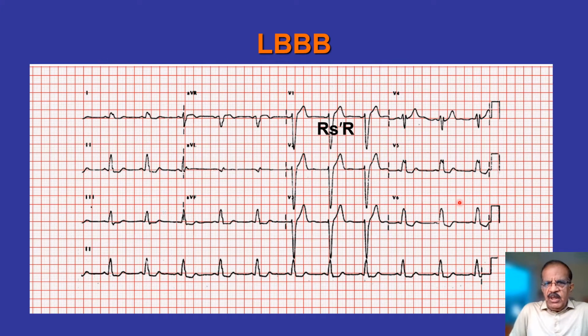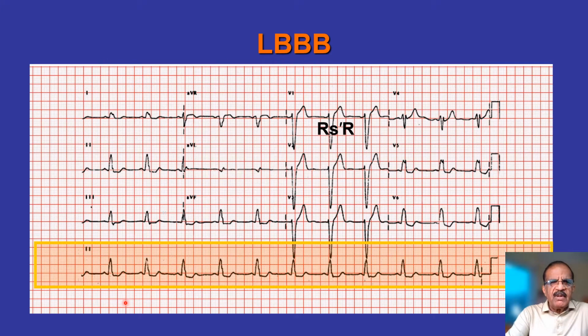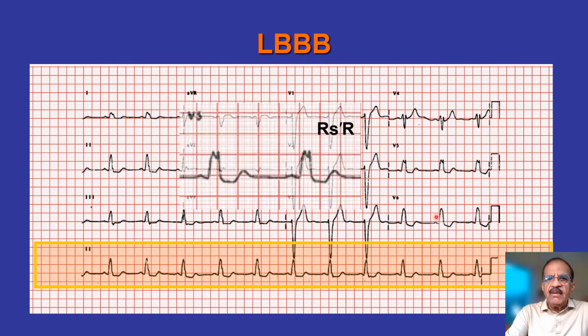This is another ECG, a revision. Now you just see the same thing. First, make sure it is sinus rhythm. Nice PQRS relationship, so it is sinus rhythm. And the second thing is we see the duration. These waves, for example, look definitely broad. All are broad, but this one is quite easy to appreciate. Let's zoom in and see it in greater detail.